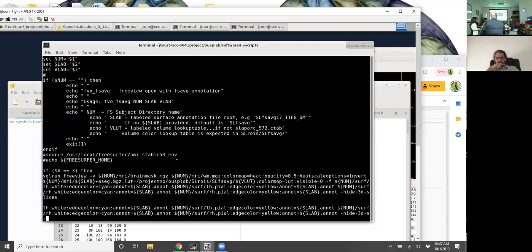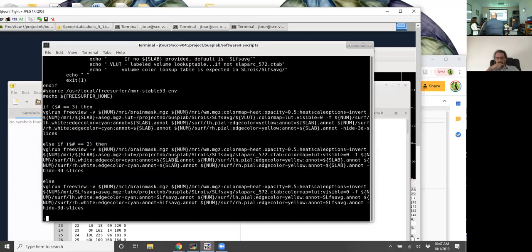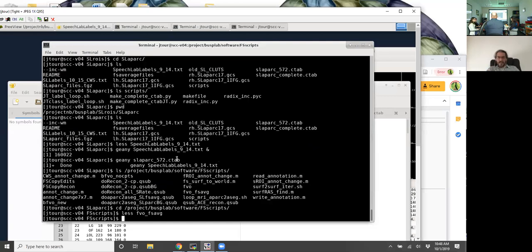And there are some other ones in there that'll load up different subsets of the FreeSurfer output. Yeah, and you'll see the Freeview. There are a lot of different flags that you can add to scripts to make them exactly what you want. So if you quickly wanted to see, okay, do the labels look like this, did all of this run correctly, I'll load them up.